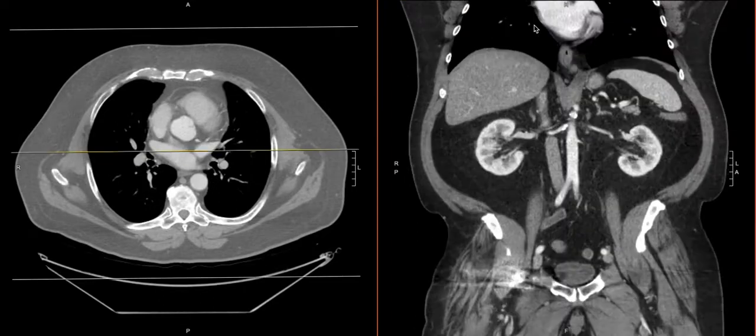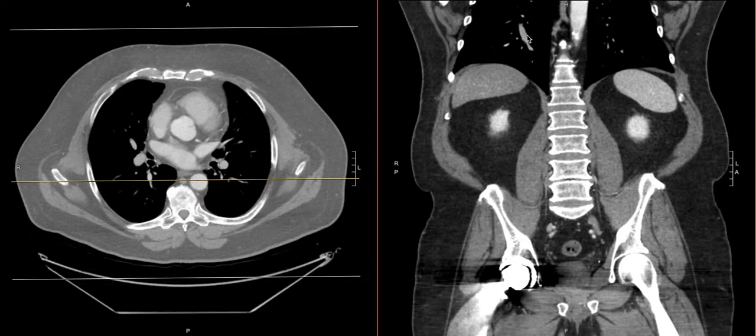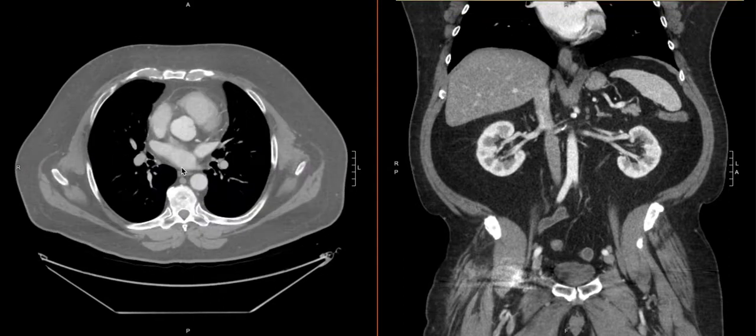And you can use the coronal here as well, which I think is helpful, just showing you that this is the pulmonary artery system, which is coming up higher from the scan and coming down low, instead of the veins that are coming back towards the heart. So the right side looks good.